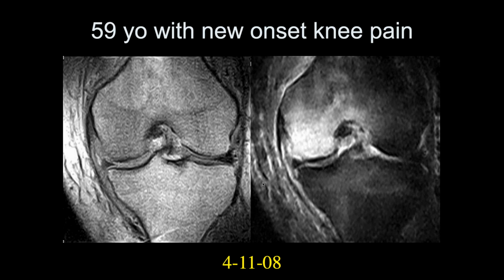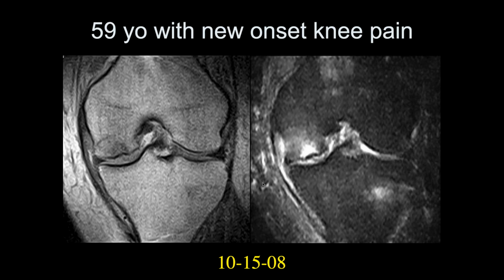Well, he did not take your advice. And this is what it looked like a few months later. And now you can see that the subchondral bone plate, I think, is fractured. It's a little bit angulated, and there's focal edema there.